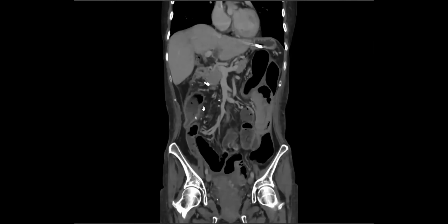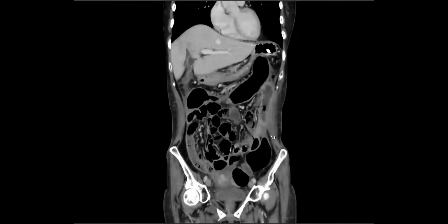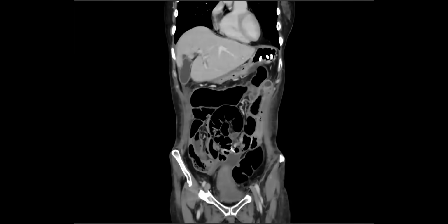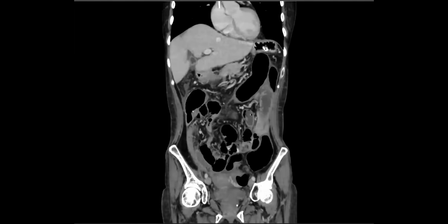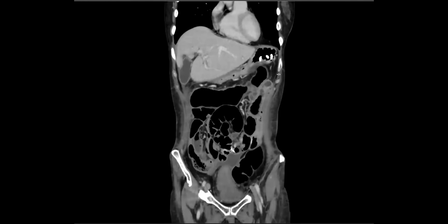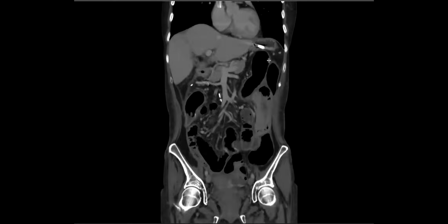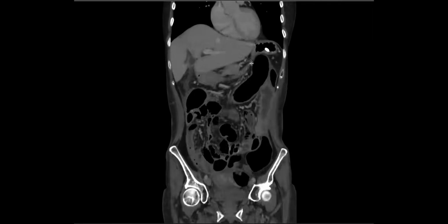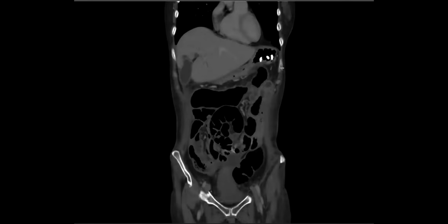Okay, this is a patient who has carcinomatosis from a colon cancer primary, and it was a follow-up treatment response, and I was looking at what looks like a pigtail catheter, but it was coming down the course like an enteric tube would be coming down, but it was not an enteric tube.